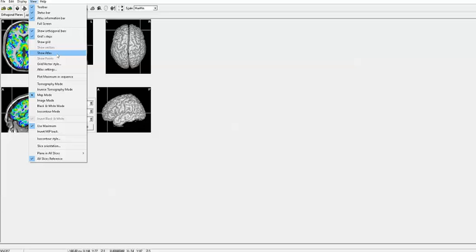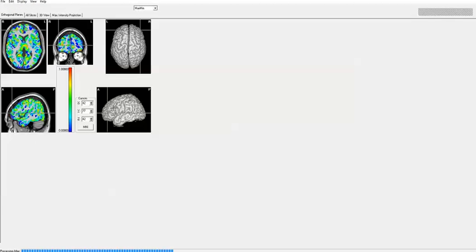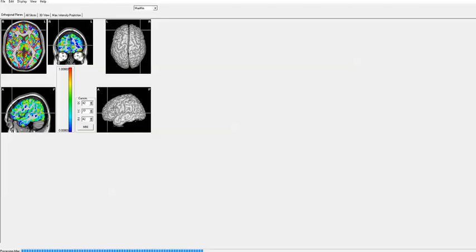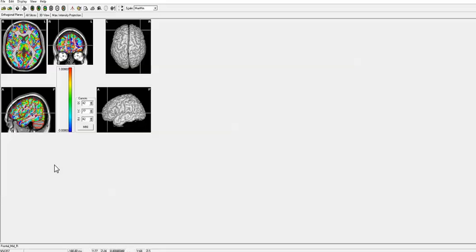These are different options. For example, we can go to an atlas and evaluate both the maximum points of energy. Up here you see contours. This, for example, is the contour of the Brodmann areas, all the Brodmann areas in the Montreal Neurological Atlas. And we can select which Brodmann area has which maximum value. And so those are contours. We can also fill those contours. We'll show in a minute.